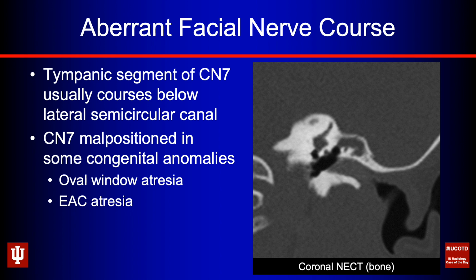And so this is a patient that had a complex external and middle ear malformation. You can see they've got membranous atresia of the external auditory canal. They have a smallish middle ear cavity. There's this really ugly, rudimentary ossicular fusion mass. In addition, they also have a congenitally absent lateral semicircular canal. So in this case, a syndromic case, they have some inner ear malformations.